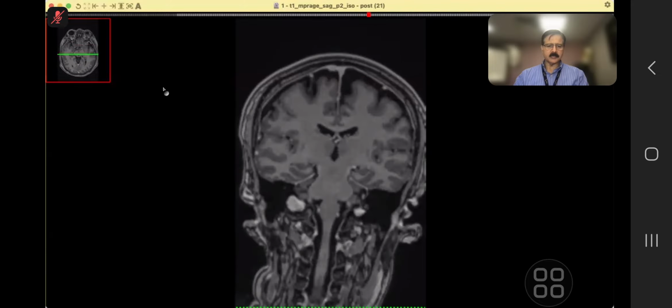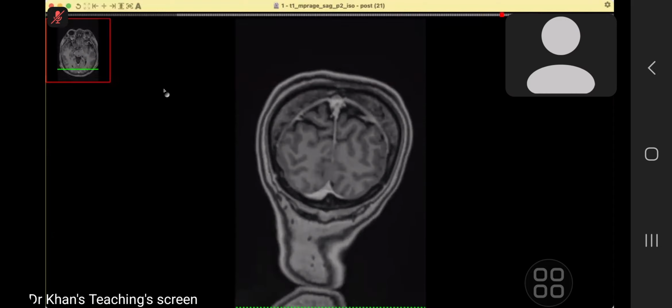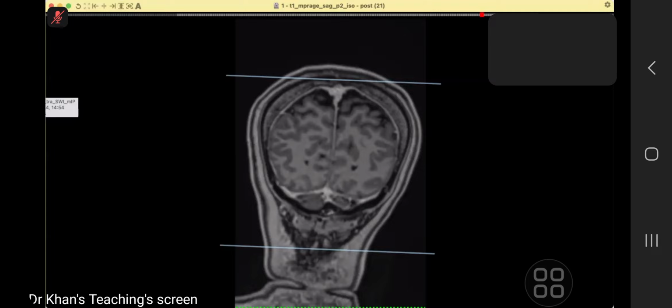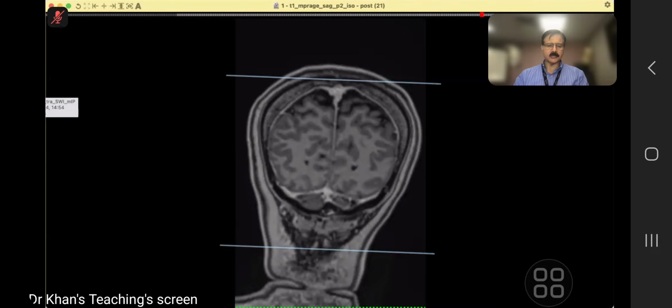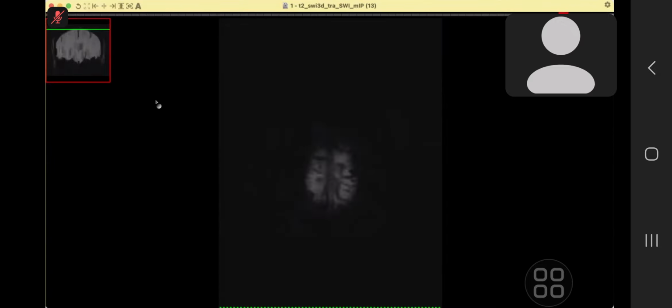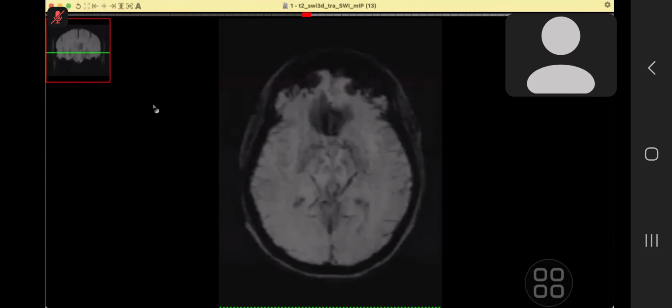Why do you say that? There was no hyperintensity on T1. Any other sequence you can check? SWI or GRE. Oh, there is blooming artifact at both subarachnoid spaces corresponding to the FLAIR hyperintense signal.